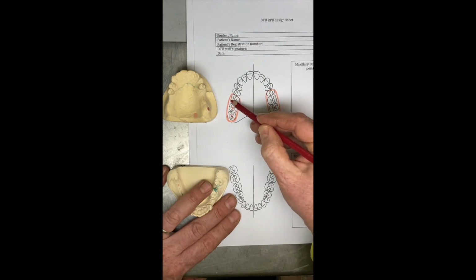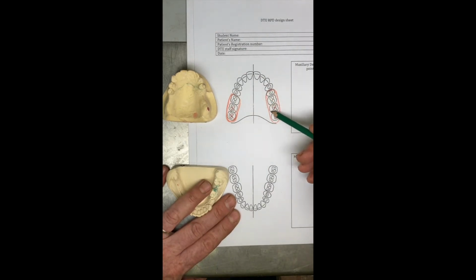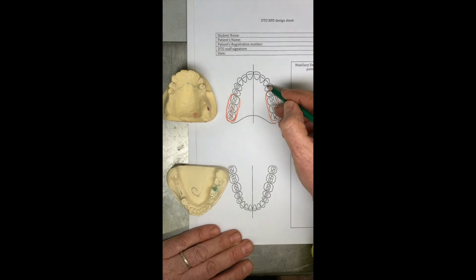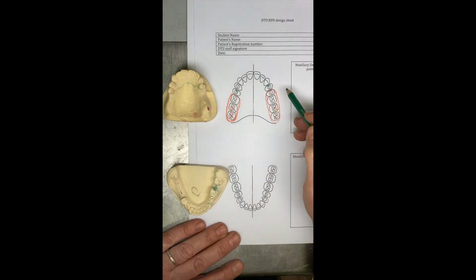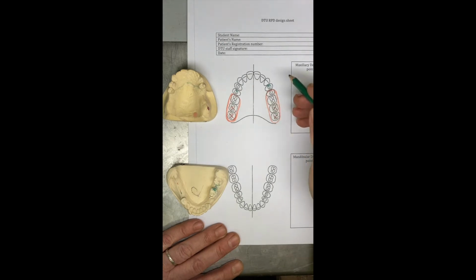And then once we've got our saddle area put in, we can go on to support. Well, the support is being provided in this area by the footprint of the denture, which we're making large, and of course will extend into the connector and so on. With regards to support, we want to apply the rule for free end saddles, so that's go on to the opposite side of the abutment tooth as a minimum. So we can put our occlusal rests on there. And then once we've got our support taken care of, we may come back to support in a minute, by the way, when we're looking at indirect retention and so on, but for the minute that will suffice.